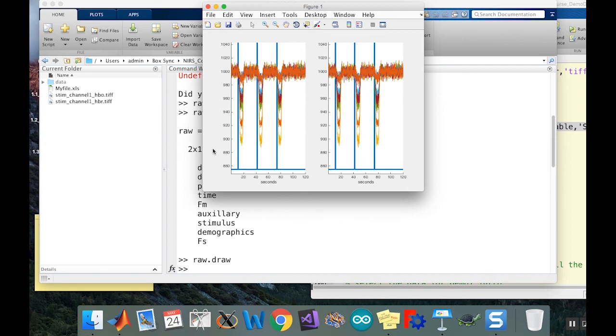We've tried to be consistent with the stats variable and stuff. If you have 5 entries in the stats and you want to draw them, it should draw an image of all 5 of your subjects like that. Just be careful, because if you have 200 subjects, this will take forever to draw, and it'll be so small you'll never be able to see it.